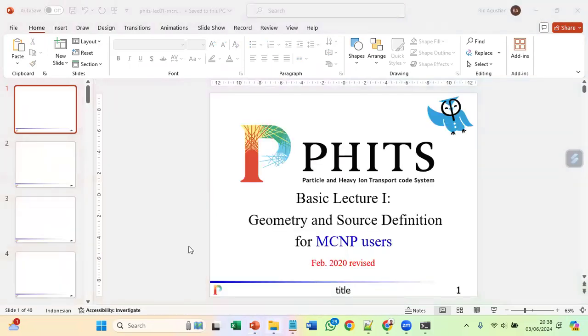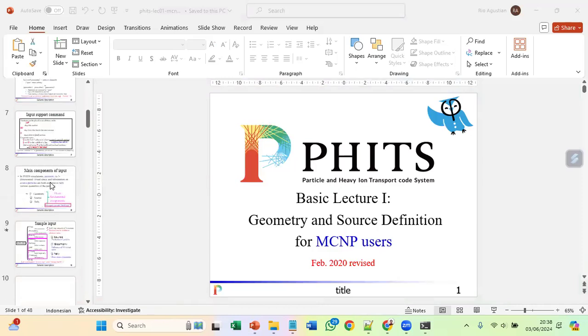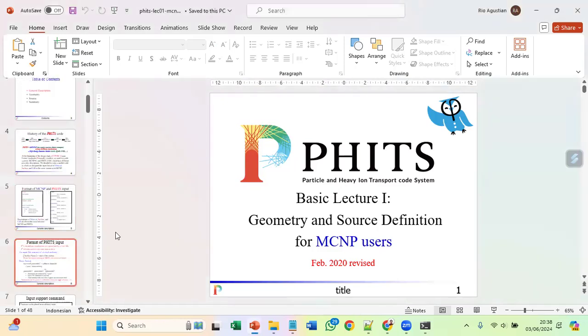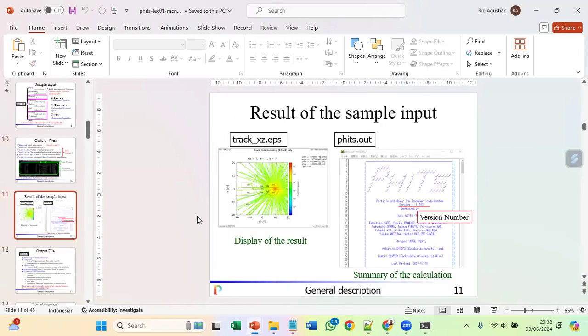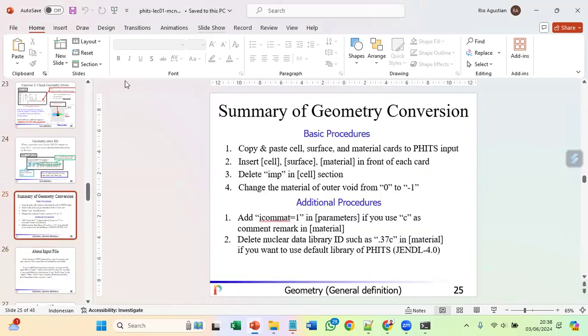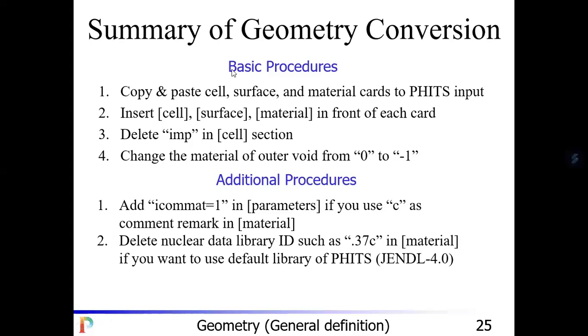And wait, I think it's loading. If you read this, you will also find the explanation that I just gave you, but in a more formal manner. Now, this is actually what I just did. So for me, I think it will be faster when I do the things that you just saw.